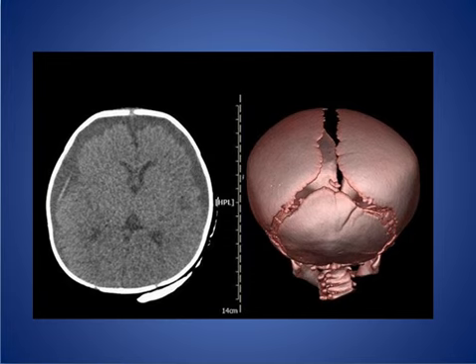Next case, this patient has a skull fracture on the occipital region, and this is a 3D image of the skull, and this is the axial CT scan.